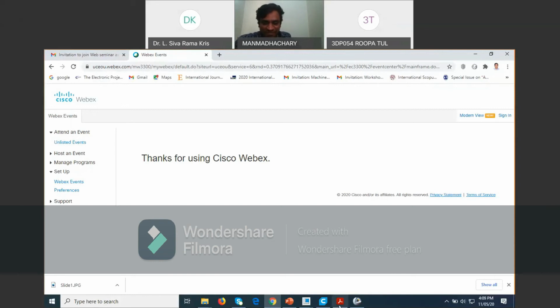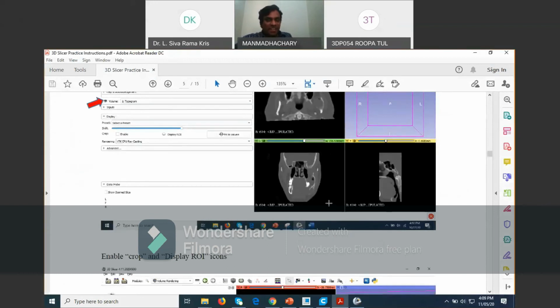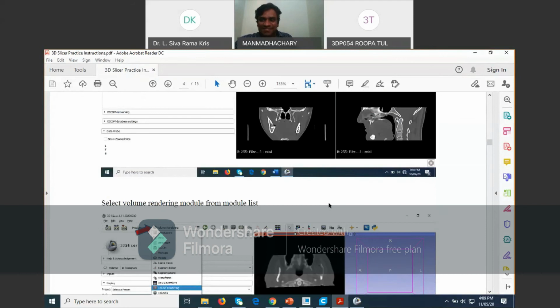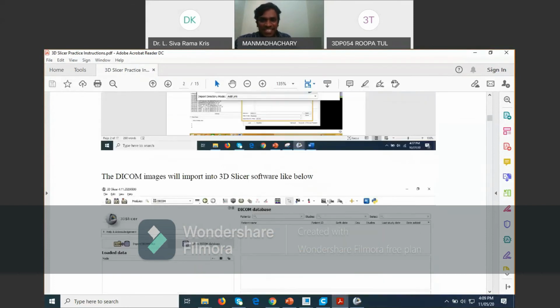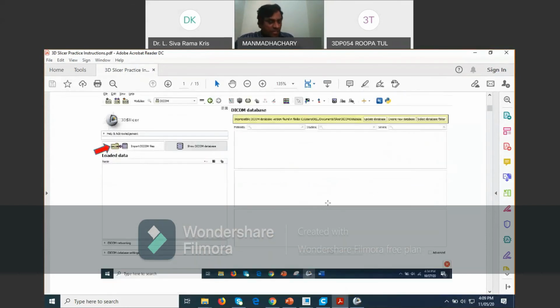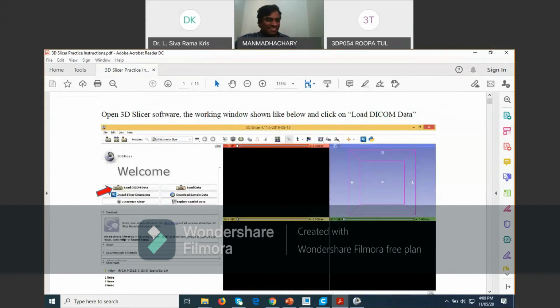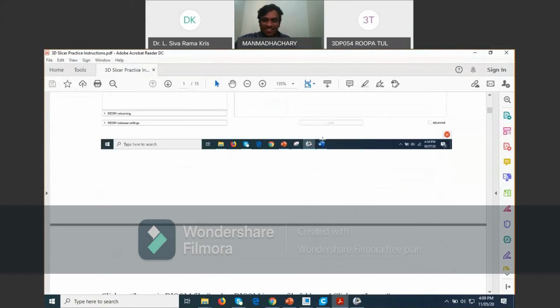But the biomedical modeling, I think it's 4 only, no? If you can, you can spend some more time. I told them, any issue, you can stay another half an hour, 10-15 minutes. Yes, sir. First we will finish the CURA also. So now the biomedical modeling is done. Got the 3D STL file, sir. Thank you, Prabhu. Got it.